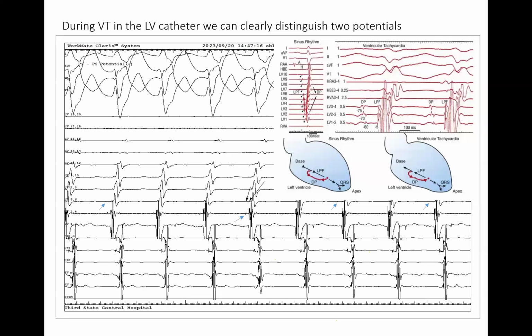But if it is a mixed fascicular VT with papillary muscle VT, it can be narrow. Still, I don't believe that this was fascicular. No, this was a papillary muscle VT. It clearly showed activation around the papillary muscle.